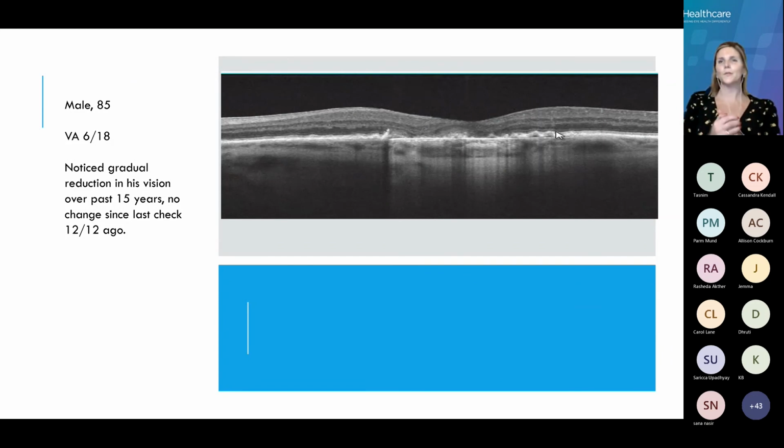Again, as you've all put, you're all starting to shout out what it is, which is great. We can see that our inner limiting membrane is smooth. We do have a normal foveal depression. Our intraretinal section, so again, remember from ILM to ELM, we can physically see is still intact. We can't see any sort of change of fluid, so we know that there isn't any sub-RPE fluid. We can see that actually either side of our macular area, everything pretty much is okay, but we do have these little rumbles in the RPE, and then extremely thinned RPE in this central section.